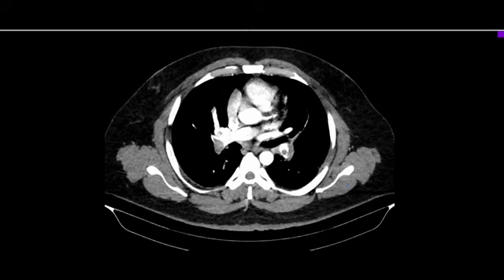For the central vessels, like the lobar or the right, left or main pulmonary artery, we give the number according to the segmental vessels distal to that central vessel, and again 0, 1 or 2 depending on the type of occlusion. So 10 on either side with a 2 maximum, the total maximum score becomes 40.